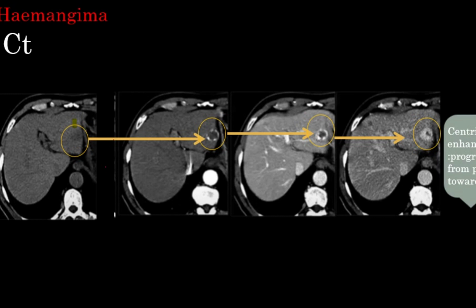It's because of its capillaries that you don't see the flow on the Doppler, because they are very tiny. But if you touch it, it's a very hemorrhagic tumor. I hate it when we do biopsies and it turns out to be a hemangioma. Usually the patient has some bleeding and some problems like that.